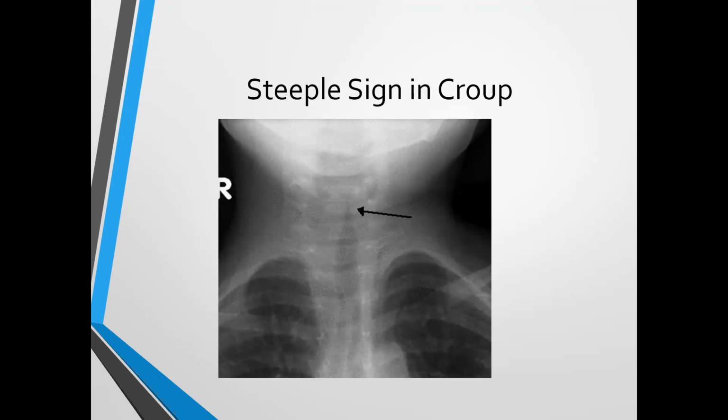So I'm very conspicuously spending a little bit of time examining this distinction and what you might actually see in a chest/neck X-ray on a patient that has croup versus epiglottitis. One of the findings you'll see with a patient that has croup, and you won't see it 100% of the time, but you'll see it in a surprisingly large percentage of cases, is a steeple sign. The black arrow is pointing here, I'm kind of circling it.